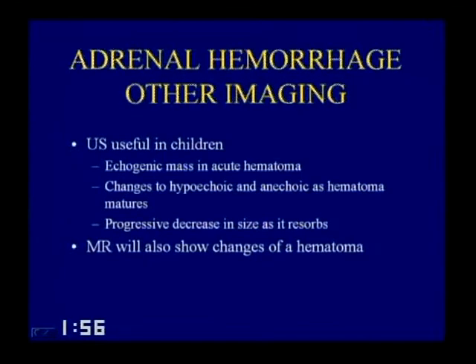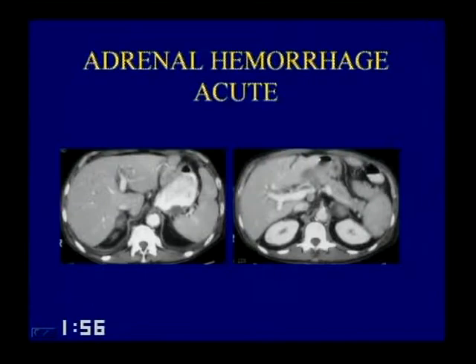So here's an example of an acute adrenal hemorrhage that was bilateral. Notice here both glands are rounded. They have slightly bright areas in them, slightly fuzzy margins, and this was acute adrenal hemorrhage in a trauma patient, and the patient did have adrenal insufficiency, extremely ill.